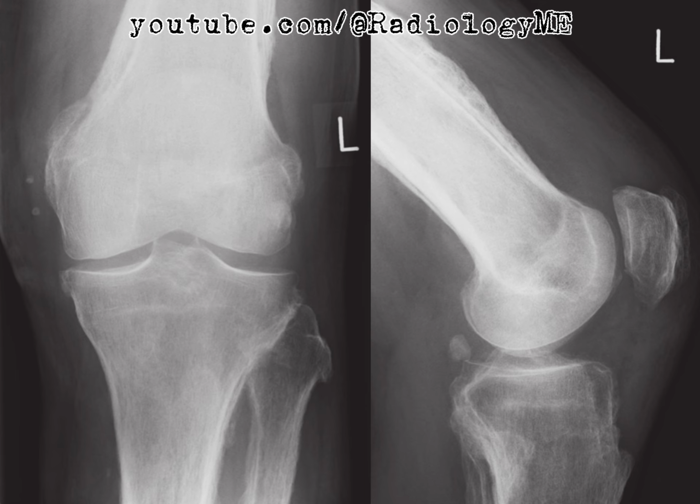The absence of any significant bony destruction or fractures is another important finding to note. Additionally, there is a small joint effusion, but nothing overly concerning in that regard. Now let's move on to consider the possible causes of this periosteal reaction.